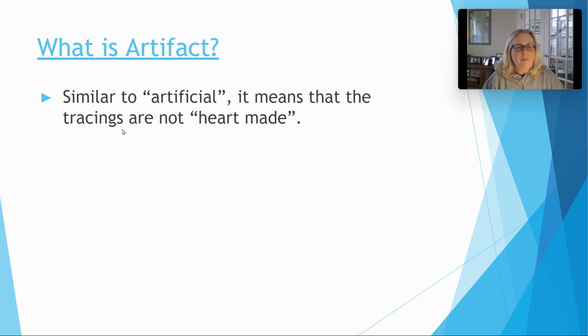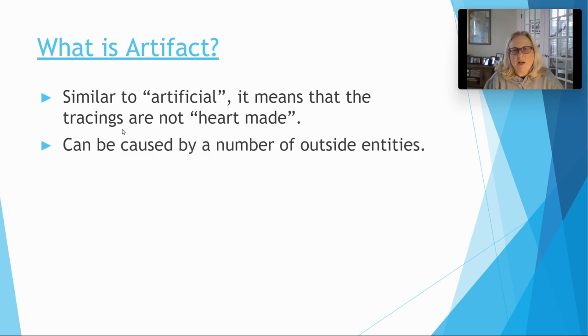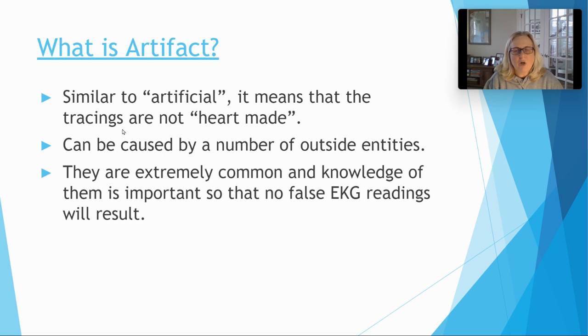Okay, so artifact, it just means artificial, so it's not coming from the heart. So something is causing it to look kind of funky, okay? So it's not that nice straight across, and you don't see the perfect PQRST. So it's usually caused by a couple different things. Once you have them hooked up, it's super duper common.